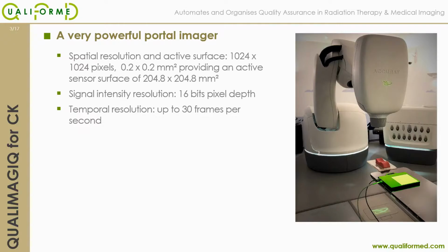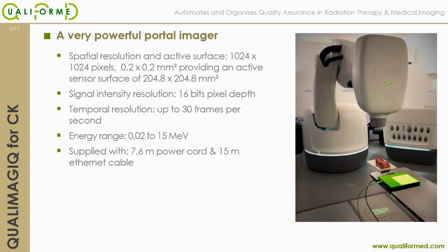Its energy range extends from 20 keV to 15 MeV, so you can imagine other applications, in particular in radiology. The imager is supplied with a power cord around 8 meters long and a shielded Ethernet cord to connect it to the QUALIMAGIQ host station.